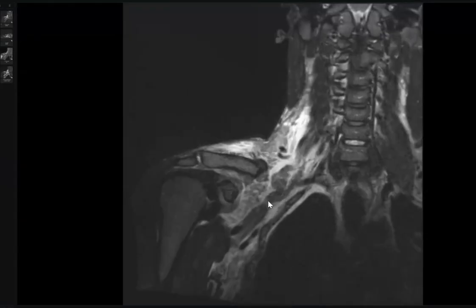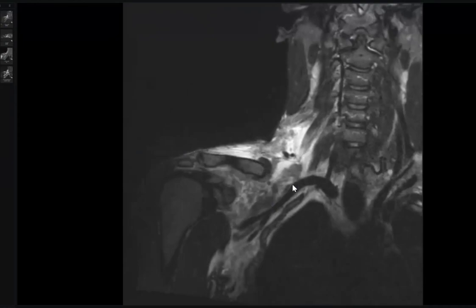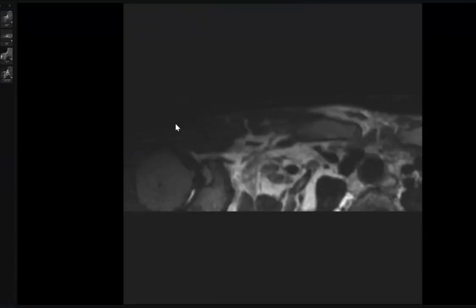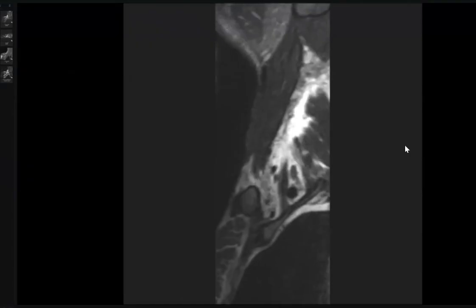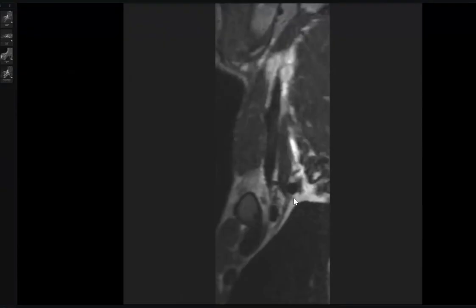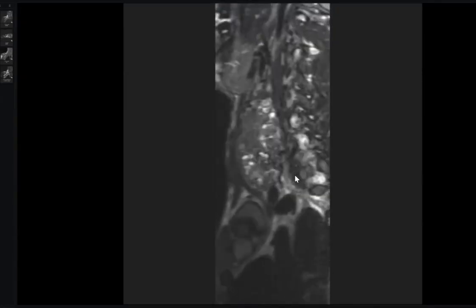retracted here. But for all of us, follow the artery, the subclavian artery, this one. At least in the axial, it is very easy to pick up because it is between scalenus anterior and scalenus medius. Look here, my colleague. This is the subclavian artery. You should see a lot of nerves here, these are cords, these are divisions. We are not experts in the brachial plexus.